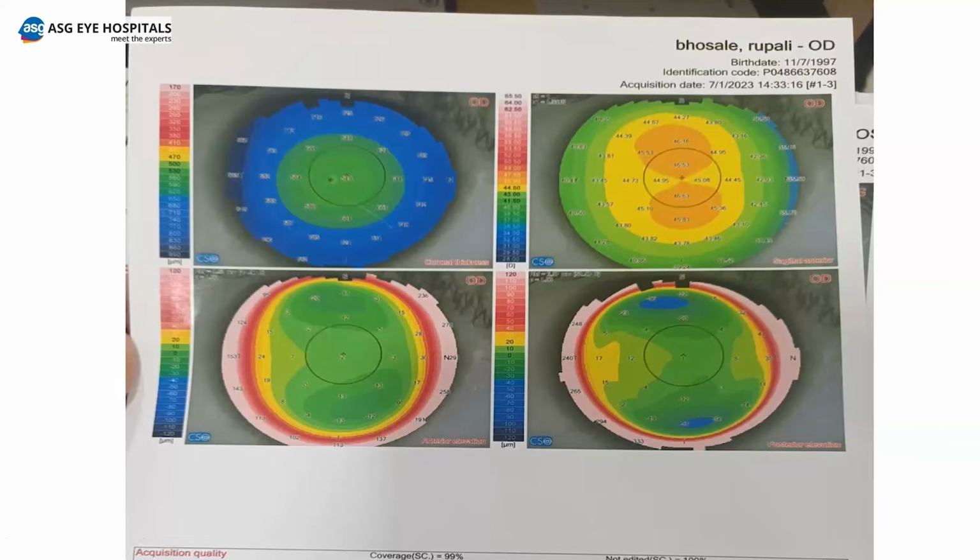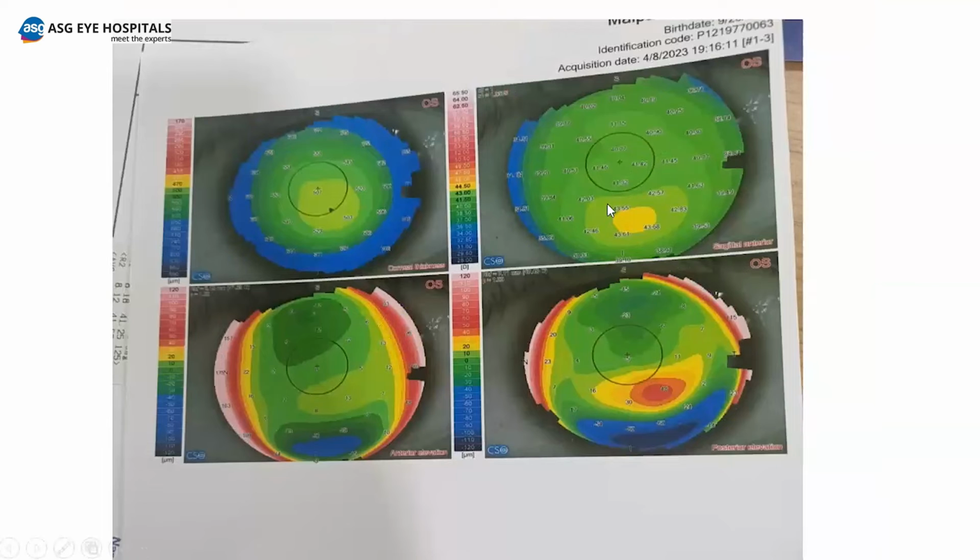Okay. Now, when we come here, what is this? Is it hot or is it cold? Ma'am, hot area. Yellow is hot. Hot, hot, hot. So yeah, there are colors. There's a map in which all the yellows and the reds are hot, and the greens and the blues are cold. So where the curvature maps are showing yellow, what are the elevation maps showing? Red. Yeah, so that means that this area is corresponding to this area. What does that mean? That it is an ectasia.